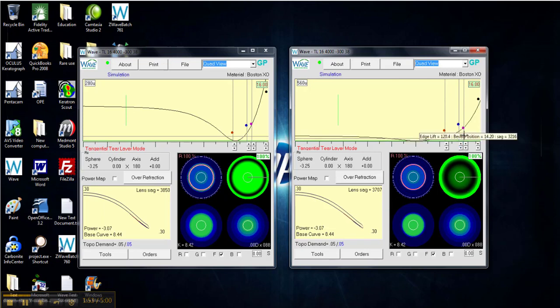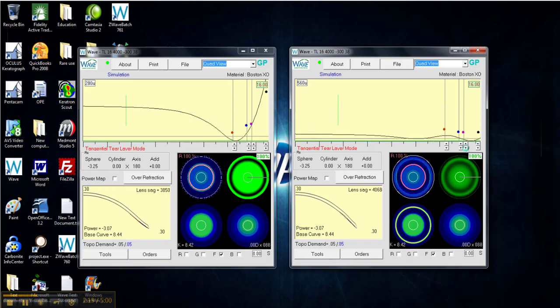And then I'll begin to lower the next point, the pink point, until it begins to create the vault that we're wanting. Takes quite a few more clicks. And then we'll get our edge angle and our edge lift with the black control point to the far right.